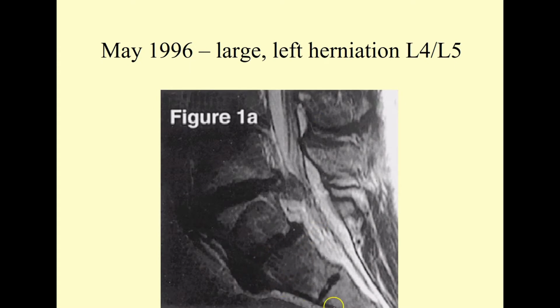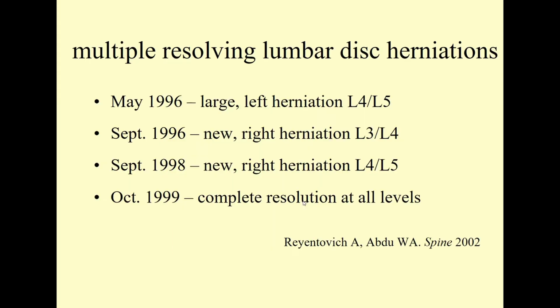So here we are. Here's the sacrum down here. This is an MR image. How do I know? Well, I know by shape this is the sacrum. I go to the outer layer where cortex is, and it's mostly black, very black up here in the front. I know this is the L5 vertebral body. Again, I'm going to go to the perimeter, and I see it's black, so I know it's MR. Now, here's the central canal. This is CSF. Here's cauda. You can see it's impacted by this rather large free fragment. And you can see the outline, the perimeter of this thing, so we know it's a sequestered fragment.